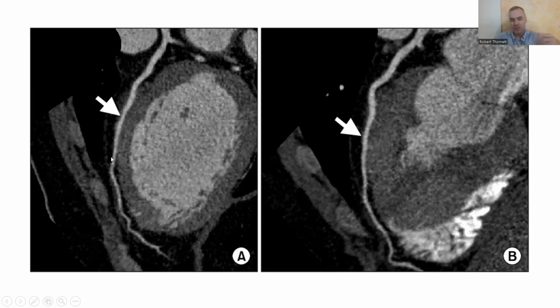As the artery goes down, it should be wider at the top and the bottom. But here you see this part is actually narrower than what comes after. That tells you it's getting squashed, right? And then it's blurry in here. It's fuzzy. That's the second thing. And then, like we said, the super telltale sign, the black just totally disappeared. The black fat that's supposed to be around the artery is just gone through this whole section right in here. So all three of the above, all three things are present. All the telltale signs are present in this one.